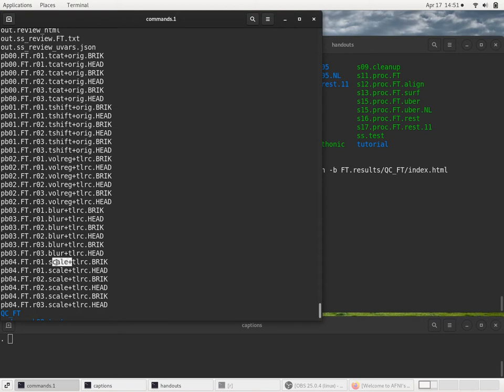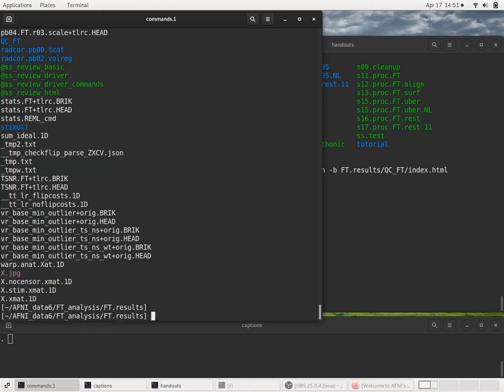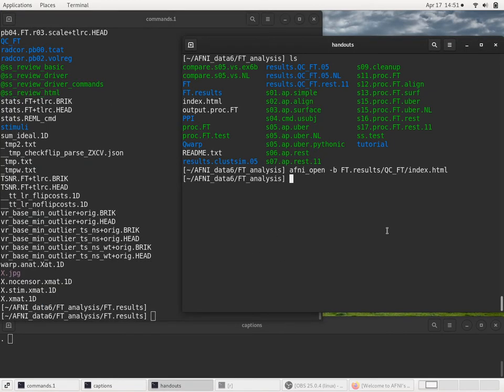And after the scaling operation, this is the data that's ready for input to the linear regression. So that's the last output as a pre-processing step. So now let's actually look at the proc script and start reviewing the data as it's processed.